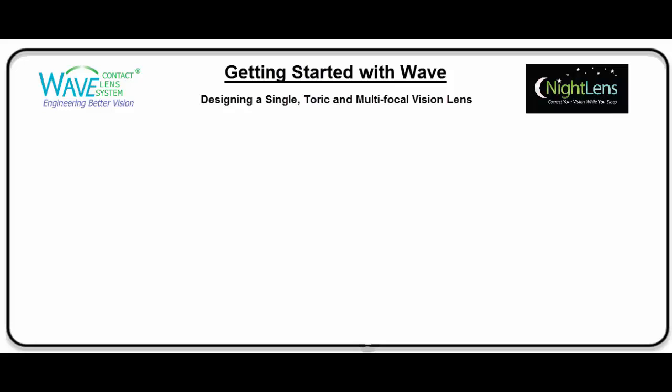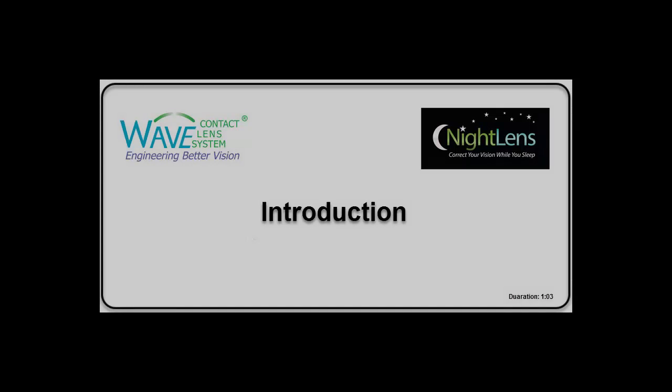Once these pre-design issues are covered, I'll show you how to actually design a single vision lens and the subtle adjustments that can be made to finalize the design. I'll also discuss how to add a multifocal component into that design. Finally, I'll go over the steps I take to review the completed design before actually ordering the lens. So let's get started.